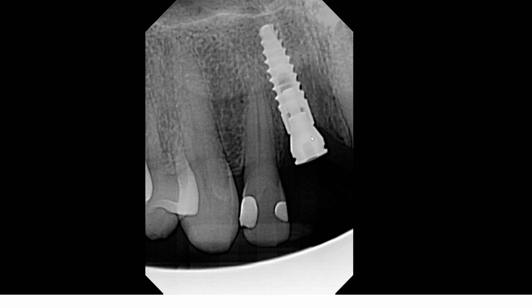Although I do not know how long ago this implant was placed, it does appear to me that it has been there long enough for normal osseointegration to have occurred. And I want to draw your attention to the proximity of this implant to tooth number 7, which is the maxillary right lateral incisor.